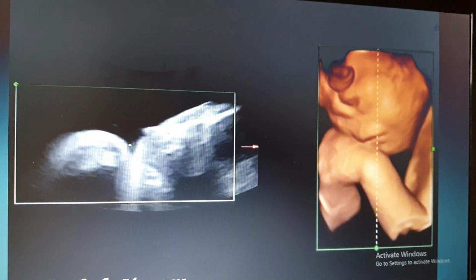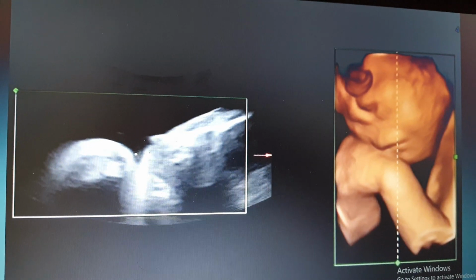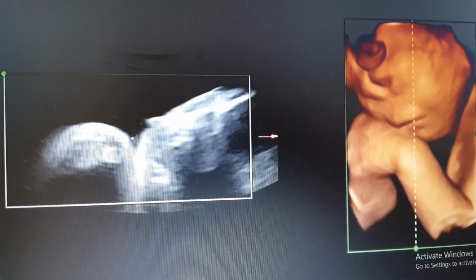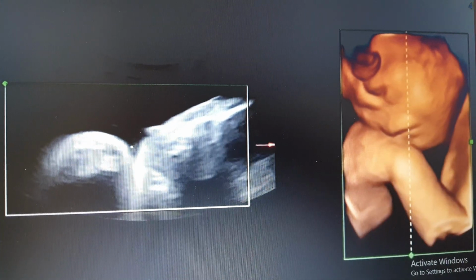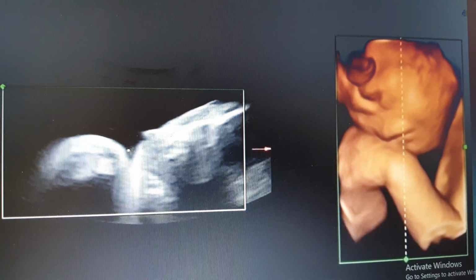Holoprosencephaly is one of the most important anomalies you should know by heart. And please, when I publish pictures of any cystic degeneration or cystic changes or cystic appearance inside the brain, remember that not all the cystic abnormalities of the brain are just hydrocephalus. There are so many different entities of congenital anomalies of the fetal brain.